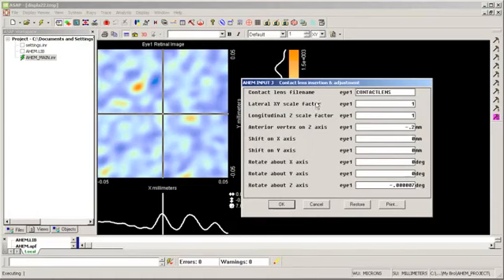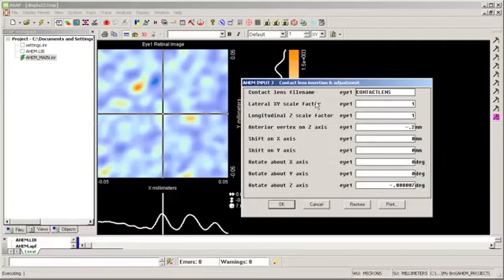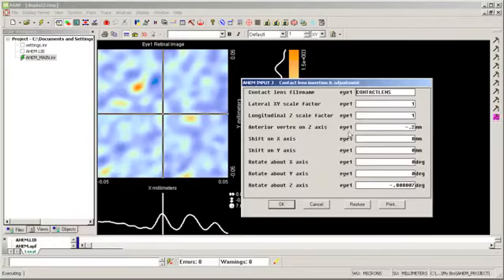So you can create a contact lens in some other CAD application or create it within ASAP. So I created a contact lens within ASAP. I have a scaling factor that I can use. I can make it larger or smaller. I can reposition the anterior vertex. So I backed it off the front in this case because the anterior corneal surface is Z0 for the entire system. So I have to go negative to back it off the cornea just a little bit.